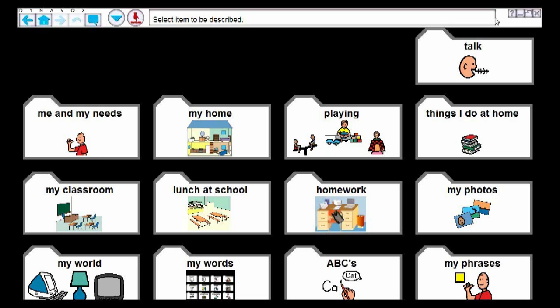So sometimes I find that handy in page editing, where there's a few more icons that I'm not familiar with. And what I can do is click on the question mark and then click on a button that I'm not sure of. So let's choose the menu button. And it'll just label it for us or give us a description. So it's the description button. Okay, so that's the title bar.